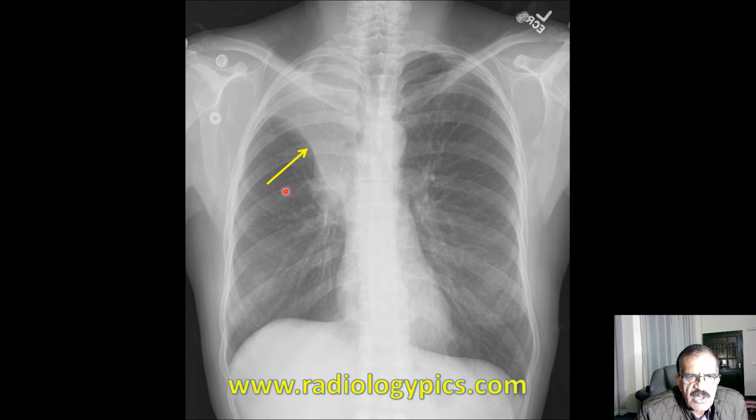But in this case, the entire transverse fissure has been pulled upward, and there is concavity. So that indicates whatever this opacity is, it is most probably collapsed lung, because it is pulling structure towards its own side. The trachea also, if you see, is pulled maybe a bit onto this opacity. This also looks like a collapse.